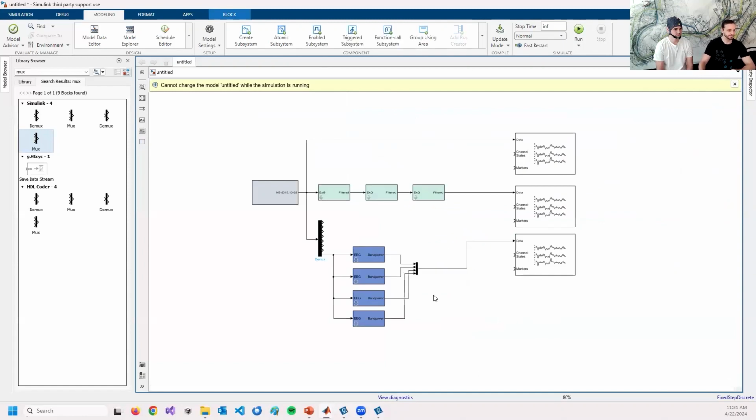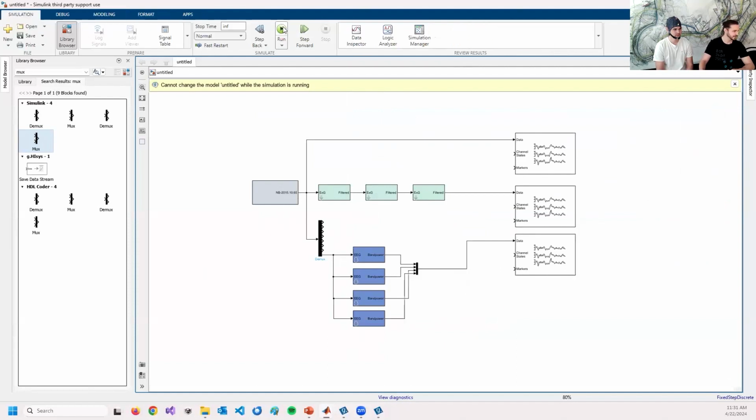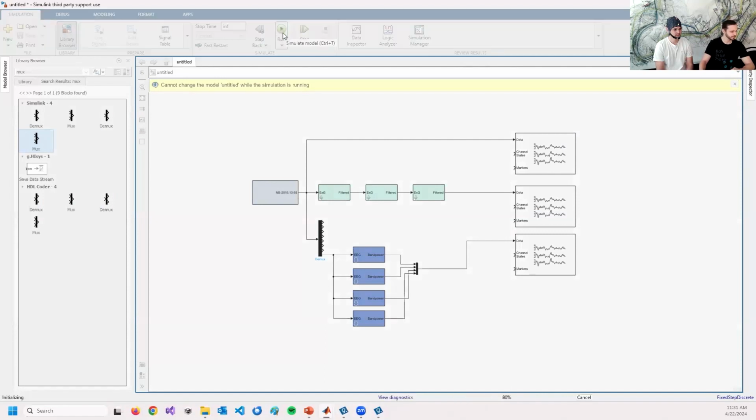So this is the whole model right now. You can see from the amplifier node, we're feeding raw data in the first scope, pre-processed data into the second scope, and some feature extraction into the third scope. And again, we can run the system now and check what changed.